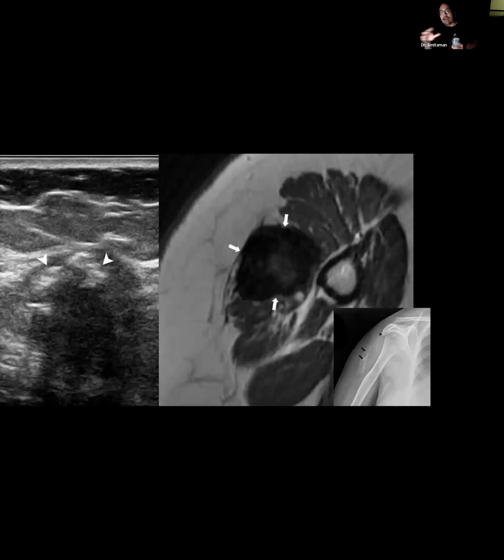Okay, fibrosis here, as we can see, calcified partially, dark on our T1 or T2 weighted sequence. I apologize, I forget. And here confirming that calcification. Fibrosis or deltoid contracture, as in this case, can be caused by intramuscular vaccinations. Classically or historically described with flu vaccines or meperidine injections, it can result in these cord-like structures, and it's actually a well-documented phenomenon. Can lead to muscle atrophy, skin dimpling, fibrosis, and as in this case, in the bottom right of the radiograph, we see this scapular winging.